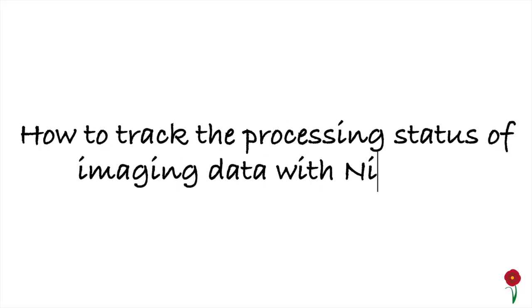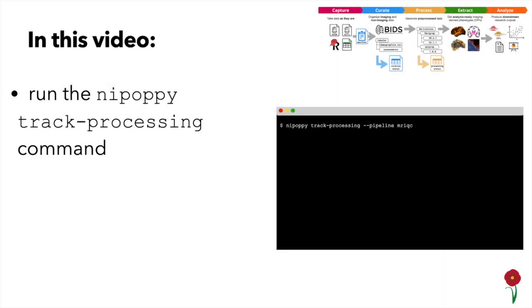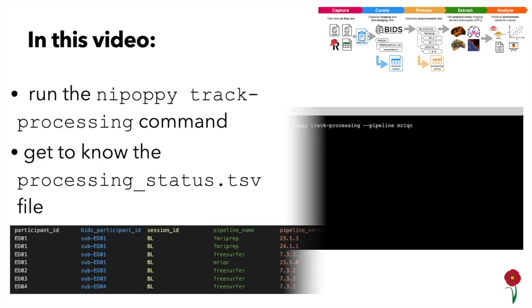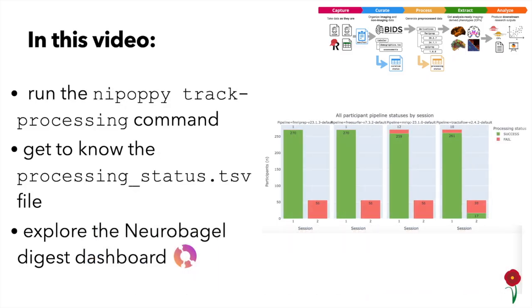In this tutorial, we will cover how to track the processing status of the imaging data in your Nipoppy dataset. More concretely, we will run the Nipoppy track processing command, get to know the processing status file, and explore the Neurobagel digest dashboard.